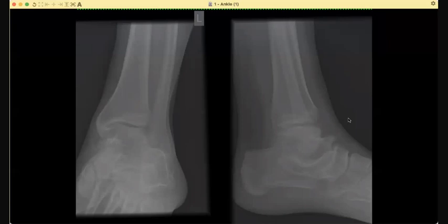Right. So what comes to your mind regarding the cause of this? It could be a variant, but this patient is symptomatic, so I'm inclined to include things like a potential... There is no real periosteal reaction to this. It's just a bony outgrowth, so it could be a benign entity. Young age group, what comes to your mind? I'm not sure at this point.